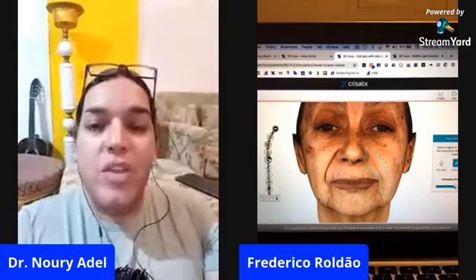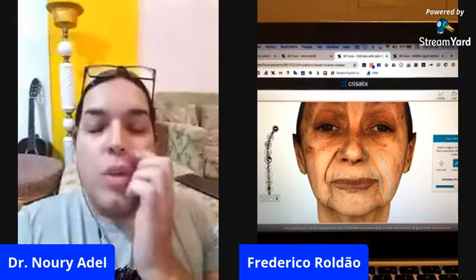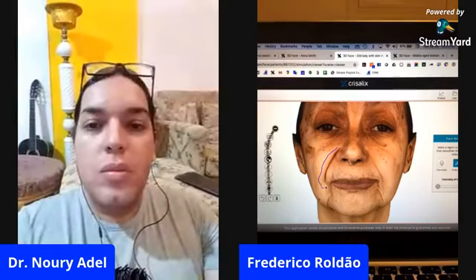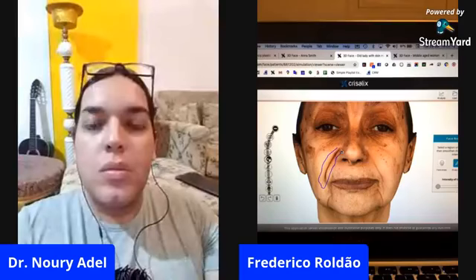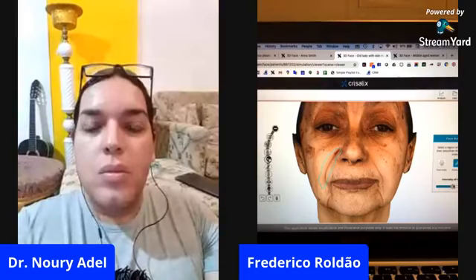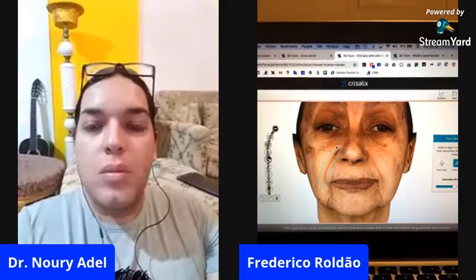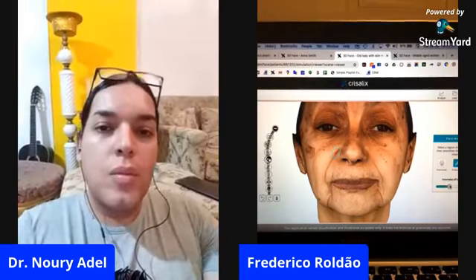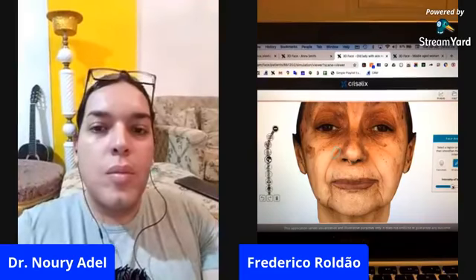Because usually when you lift the cheek, the nasolabial fold is going to be eliminated a little bit. Exactly, and that's the effect that I wanted to resemble with the simulation. And I'm drawing with my hand on my trackpad. I'm not a very good artist. Okay, a bit of the wrinkle away. I would go there and try to work on that wrinkle over there as well.